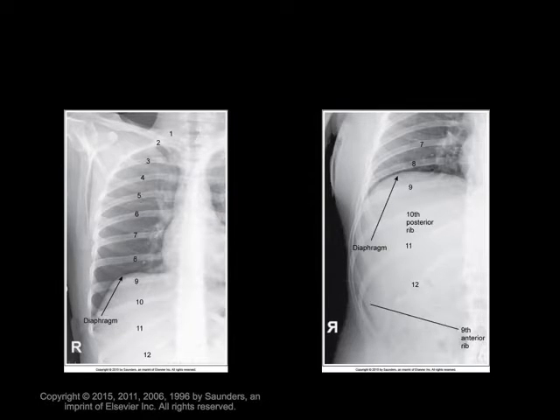All right, let's talk a little bit about these images. Is this just a bad chest X-ray? We've got two different images of some similar anatomy, both according to the marker of the patient's right side, and so they're correctly projected here. And it looks like these numbers are giving us a little hint here. We've got some numbers along the ribs, and these are unilateral ribs specifically, upper and lower.